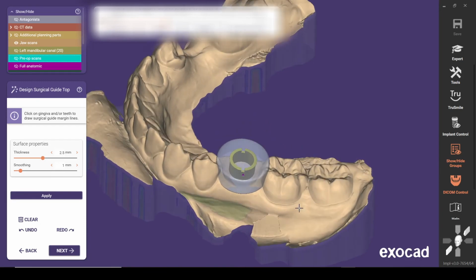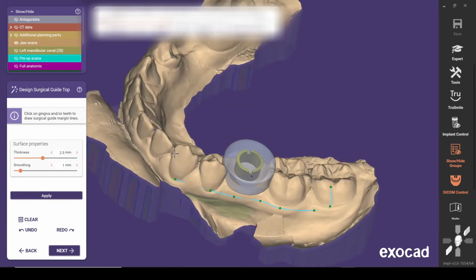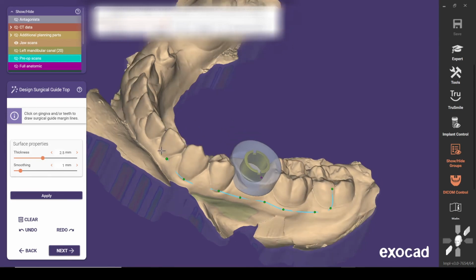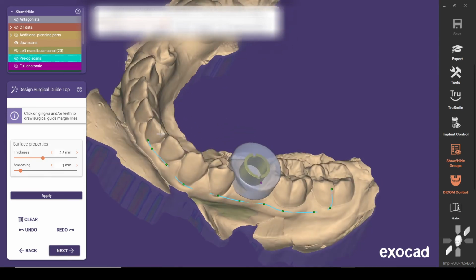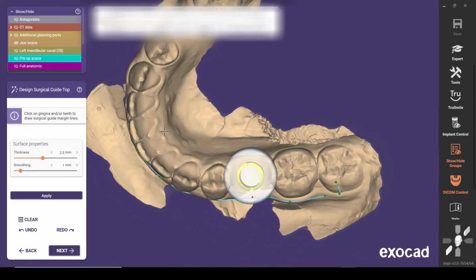I don't like to run the distal extension of the surgical guide through an embrasure. I like to have it come down to a cusp. I'm going to run it at the gingival margin, right around here. I like to extend it on a posterior guide so you're rounding this corner a little bit. If it's too minimal, the guide is a little bit unstable and it can rock. So by running this guide around, you're going to gain a lot of stability in your guide.